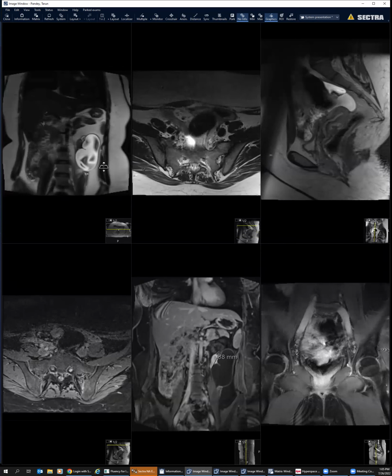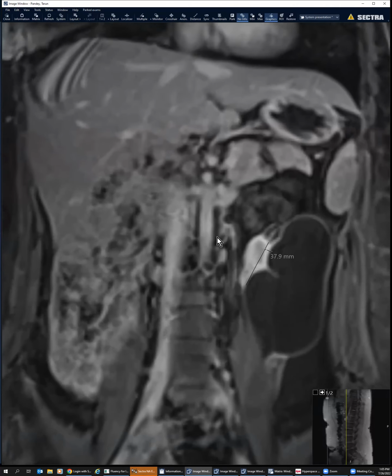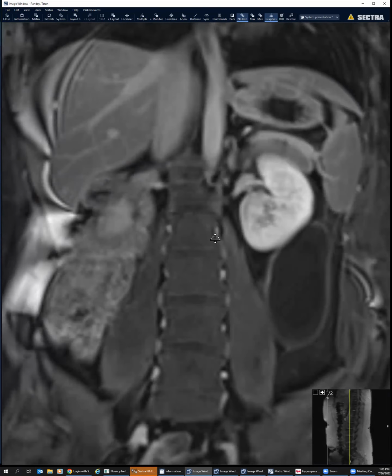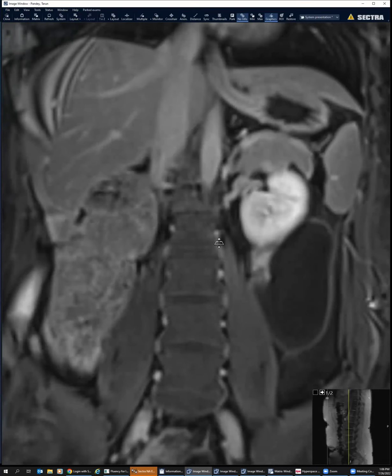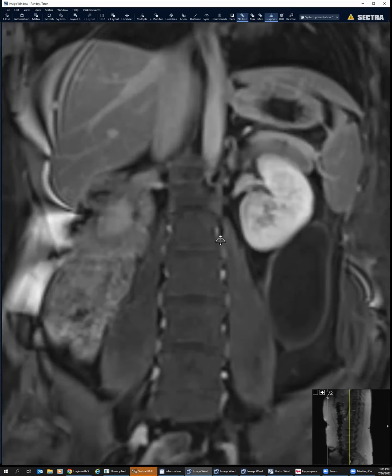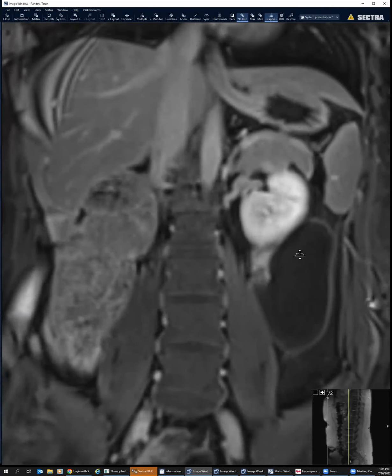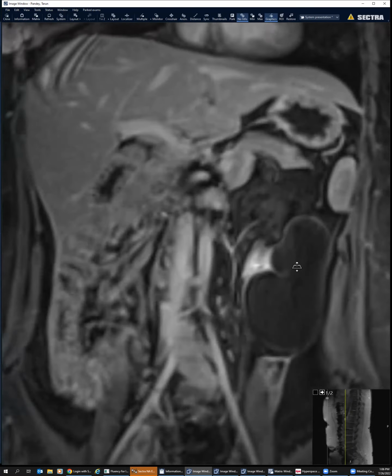The one in the left abdomen, can you actually zoom in on that? Yeah. What is that? It's crazy looking. Initially I thought it could be like an extra kidney. Right, and we also thought that maybe it has got a renal origin, but it doesn't have that claw sign. It just abuts that, but it's a retroperitoneal location.